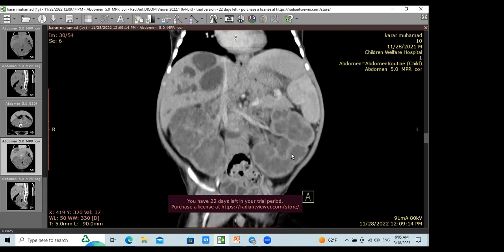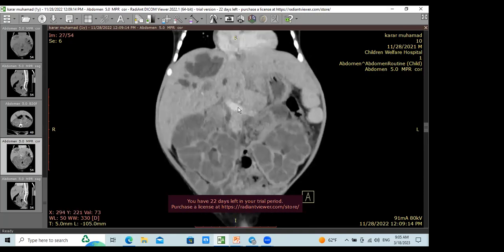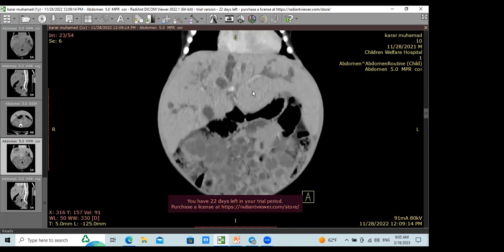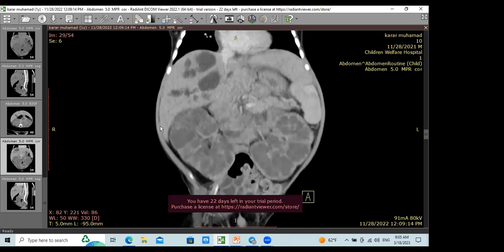Okay Zaid, continue. Yes professor. Actually, two male siblings of about the same age presented with liver failure and a hugely enlarged liver. Both of them had an attenuated portal vein by ultrasound. The ultrasound images show the central dot sign, as seen in the presentation before, and the spleen is still not enlarged. A very dyspneic, tired patient, and both kidneys are large in size and echogenic.